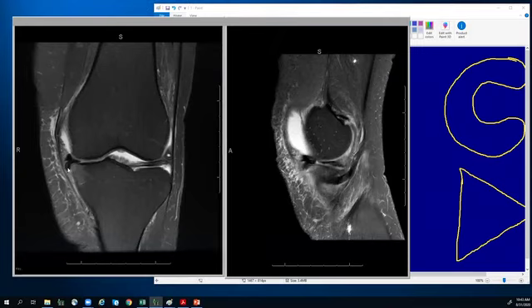And the pathognomonic sign in terms of MSK imaging is called the meniscal comma sign, because the appearance of this flap tear, especially when it's displaced in the inferior gutter, takes on the appearance of the comma symbol that you would use to separate a sentence. So this is called the meniscal comma sign. If this same type of flap tear was more superiorly oriented, I've seen some people refer to this as the meniscal apostrophe sign, because then it would basically look like a comma, but higher up, looking like an apostrophe.